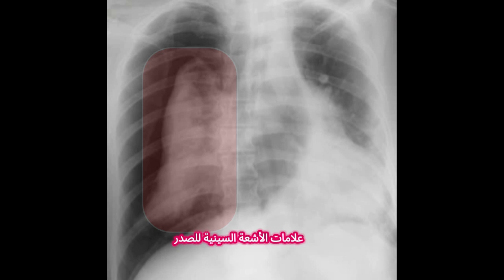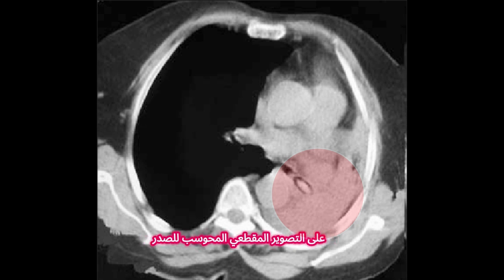Chest X-ray signs. On a chest X-ray, total lung collapse shows as a whiteout or opacity of the entire hemithorax. This is due to loss of aeration. CT scan findings. On chest CT, the collapsed lung tissue will appear as a dense, compacted structure.